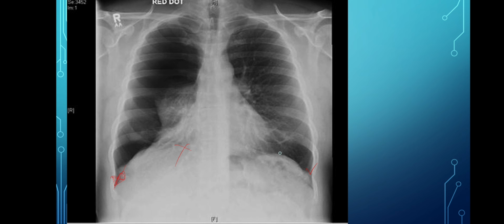The cardiophrenic angle of the left side is present, and the left lung is hyperinflated, and the dome of diaphragm on the left side is normal, but the right side dome of diaphragm is not seen. The trachea is in the midline. There is a radiolucent area seen on the right, involving right zone 1, zone 2, and zone 3, and there is a white radio-opaque area presenting in the hilum region, and no bronchovascular markings are seen in the radiolucent area.